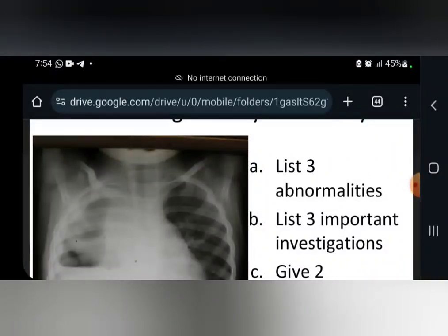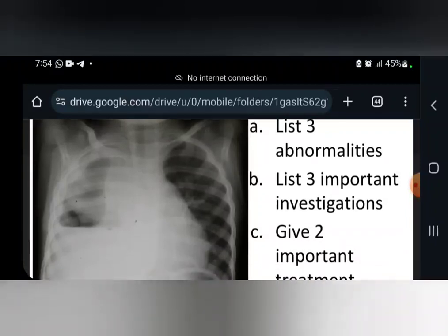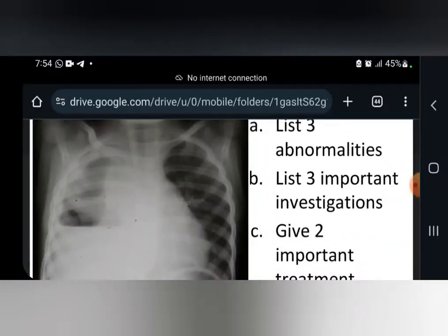Which is called sarcoidosis. Now, the difference between hilar opacity in sarcoidosis and hilar opacity in pulmonary TB is that the hilar opacity in pulmonary TB is going to be unilateral, while the hilar opacity in sarcoidosis is going to be bilateral. And generally, you have to know that the hilar opacity on the left side of the lung is ring-shaped, like a ring, and the hilar opacity on the right side of the lung is like a comma shape. Is it clear? If you look very well at this X-ray, you can see a comma which is very wide, which is inside this opacity that was medial.